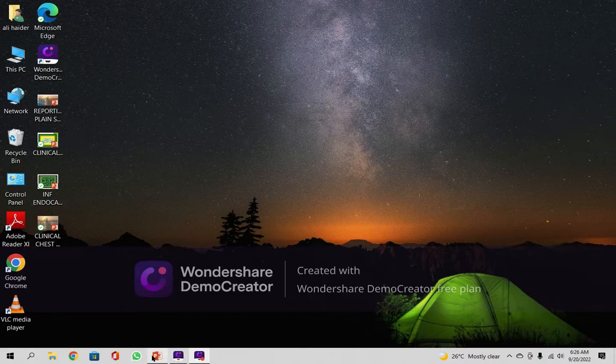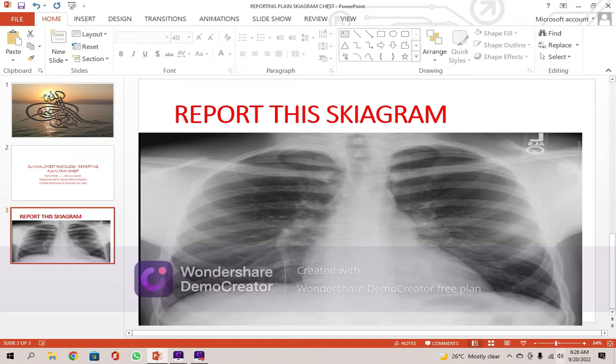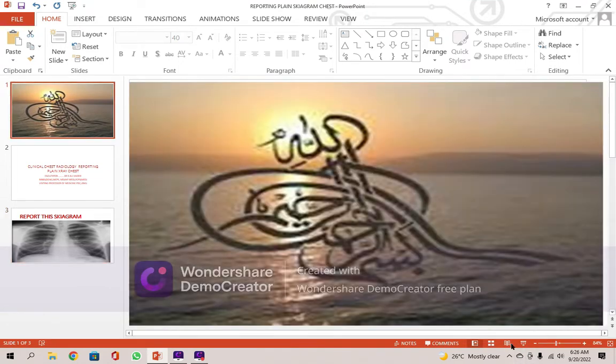So today I want to present one of these in front of you. And now starting with this one.